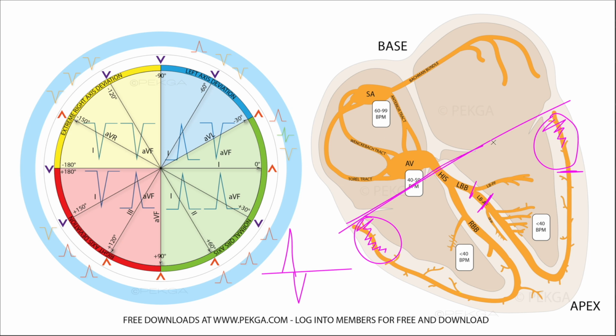If you divide the heart into ventricles and atria, you can refer to this region as a region that's closer to the base of the heart. That's why it's called the basal region, right? Your S wave represents depolarization in that region.